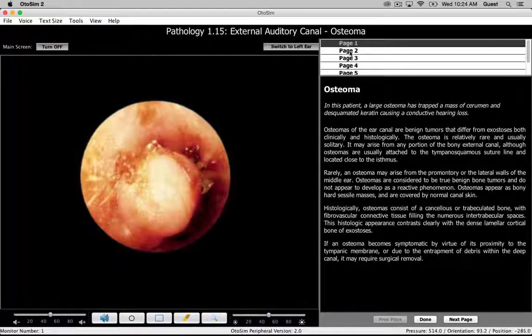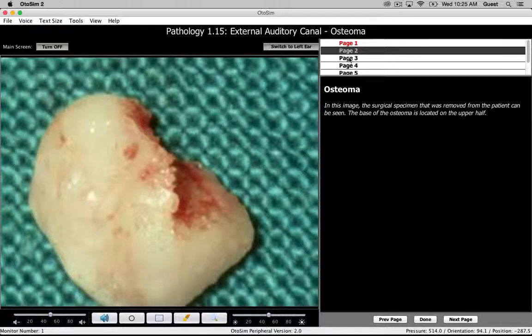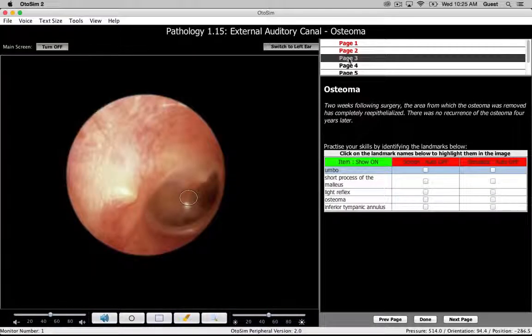If you want the next example, you go up to the top right of the screen and you get page 2. It gives you some pathology and some other instructional material as well. And then, as I mentioned, on any of the examples that we're choosing here, a screen shows up. In this case, there's now a 3-part screen.